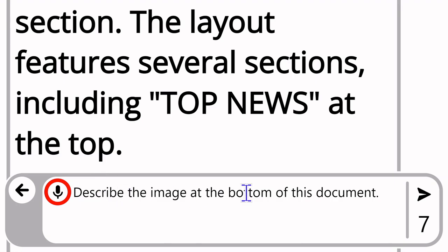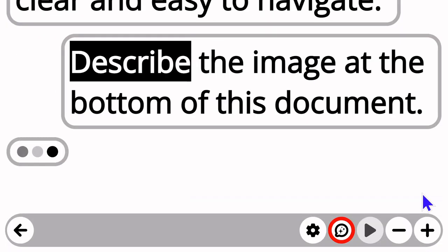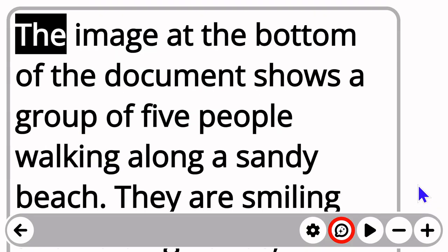But this looks good. To the right, I'm going to tap on my submit button, that little paper airplane, and you'll see that the voice input is working and the question has gone to our cloud services and a response is sent back. So I'm inserting this into the demonstration video just so that you can see that voice input does work as intended. Again, I'm not sure exactly what went wrong. Maybe there was a conflict between Zoom and my microphone. We'll now continue with the recording from yesterday.